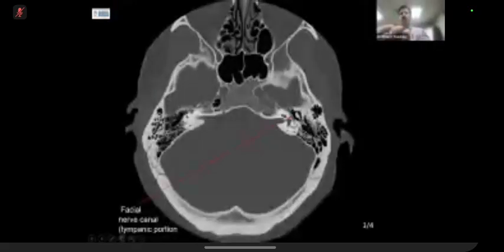Yeah, so then that has to be the facial nerve. So name the parts. Hint is, yes, the parts that I need to name. So this part one here is the same part which you saw here. Okay, the tympanic. So this is the tympanic part. What is this part?